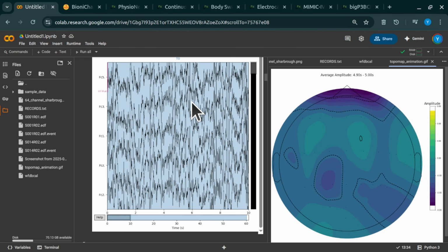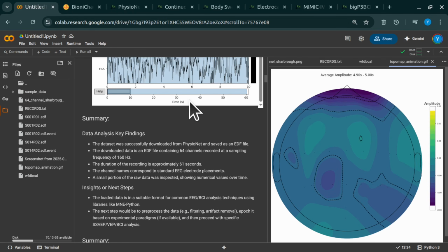Well, we used a pretty standard tool in the Python world, Requests, for the download. But here's where you get that first little real-world twist. Ooh, what happened? The file downloaded as a .zip archive, or at least that's what the system thought it was. Ah, okay, so what was it actually? Exactly. It's a common thing, assuming file types. We had to look closer, inspect it, and realize, this is actually an EDF file, European Data Format.